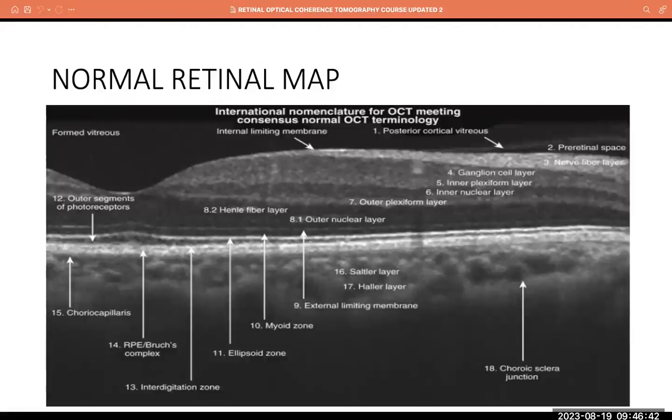So the macula is devoid of certain layers of the retina. That's the fovea itself, not the macula. The fovea, the foveola, the depression is devoid of certain layers of the retina. You can see from the OCT, you don't have the nerve fiber, ganglion, inner plexiform, inner nuclear. It starts actually from the outer nuclear, but here Henle's fibers multiply because of the arrangement and the number.